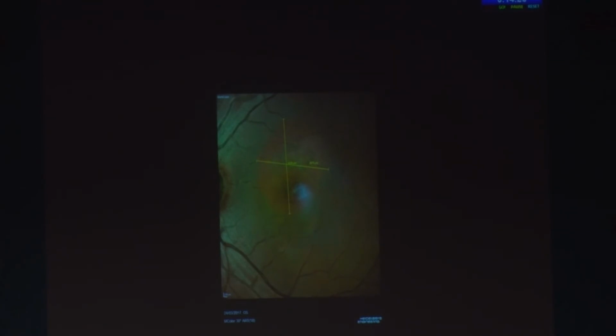So why is it reddish? Well, for one, I think it's the RPE which is slightly disturbed, or there's something under that which is showing up. I'd rather have to see the other three, infrared, green, and blue to make a more educated guess. But the push on the RPE, I think, is leading to that discoloration. So just to touch on what Manoj said, there are three modalities, three laser lights going up. The red goes to the deeper, so any disturbance in the deeper layer picks it out as a well-delineated part, differentiating a normal versus abnormal pathology, basically.